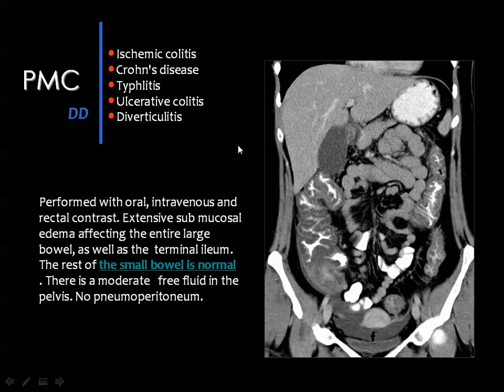And we have mentioned this particular issue: in order to diagnose diverticulitis, there should be some pockets of air-filled diverticula in the affected segment of the colon. And diverticulitis is usually a localized disease of the left side of the colon, not affecting the entire colon as in this particular case. Whenever we discuss these issues, you will know the difference easily.